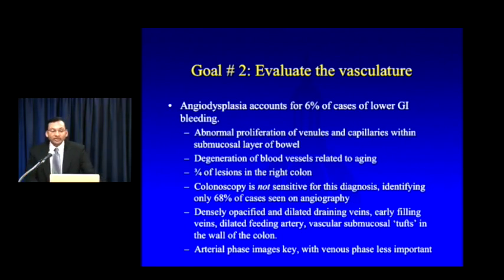Now, unfortunately, this is one of those situations where colonoscopy is insensitive, identifying only about 2/3 of all cases that are ultimately seen on angiography. So as a result, I would argue that this is one area where CT can clearly outshine colonoscopy, provided that you take the time to look for the diagnosis.